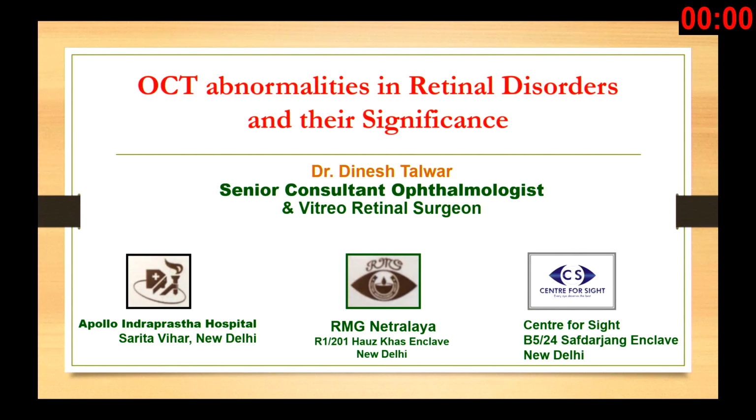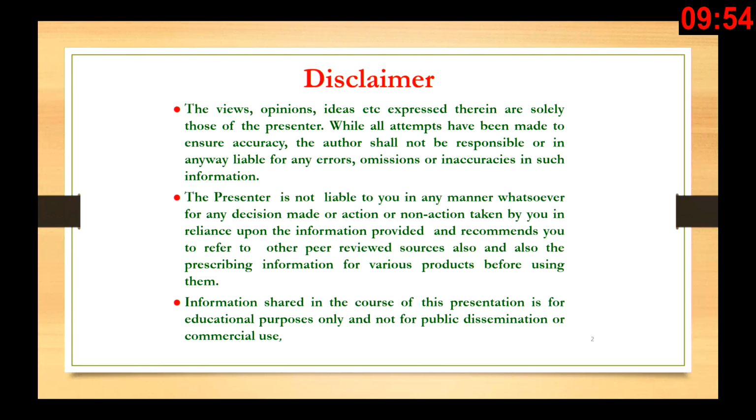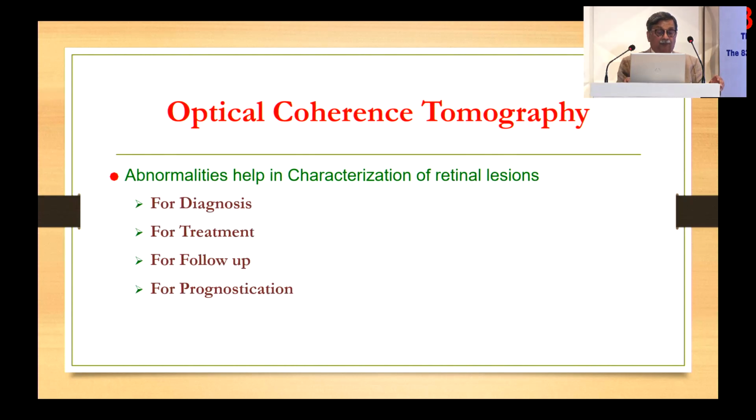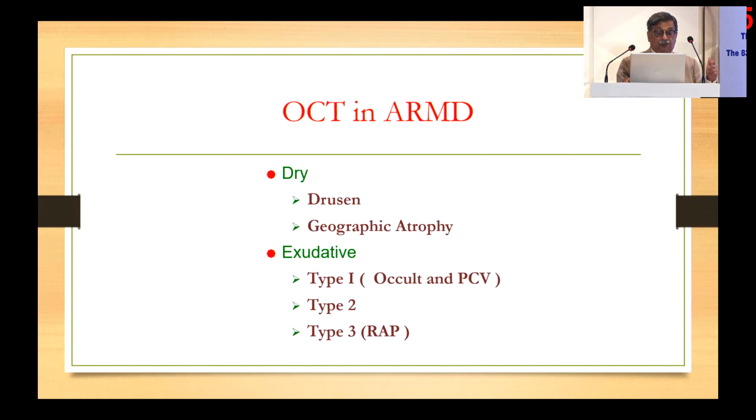Thank you. Ladies and gentlemen, you've already been exposed to the kinds of abnormalities you see in the retina on an OCT. Now, let's discuss their significance. This is my disclaimer. The fact is that OCT is the bedrock on which the management of retinal disorders is anchored, both in terms of their diagnosis and in terms of their follow-up. The abnormalities that we will see can be used for diagnosis, for treatment, for follow-up, and for prognostication.